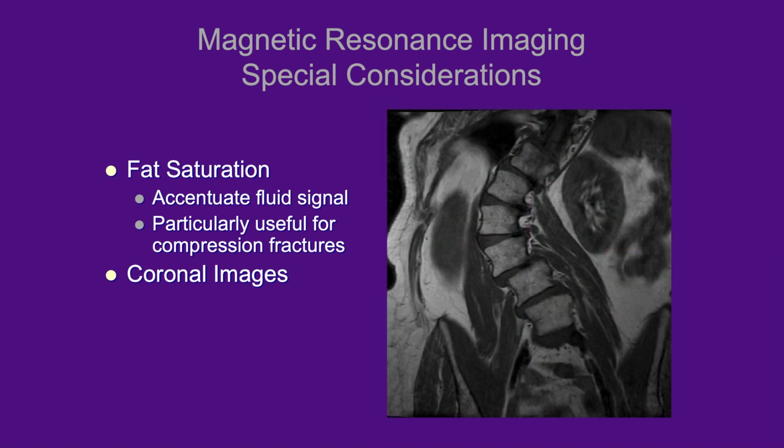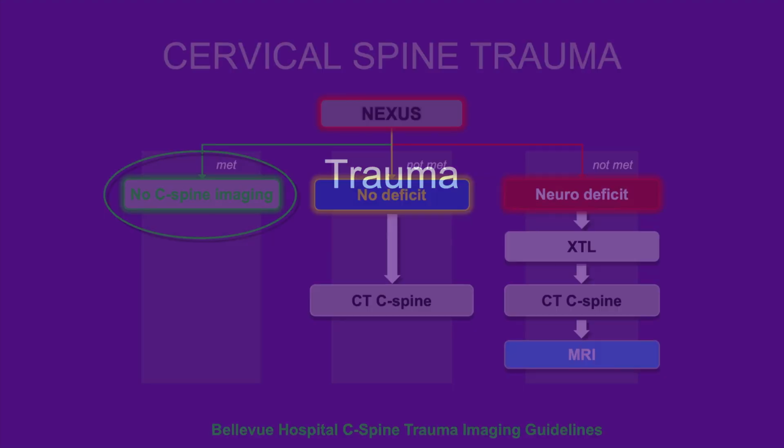Coronal imaging is not part of our routine protocol. However, we will utilize it when imaging patients with severe scoliotic curvature. Let's move on now to the first of the pathologic groups and talk about trauma.